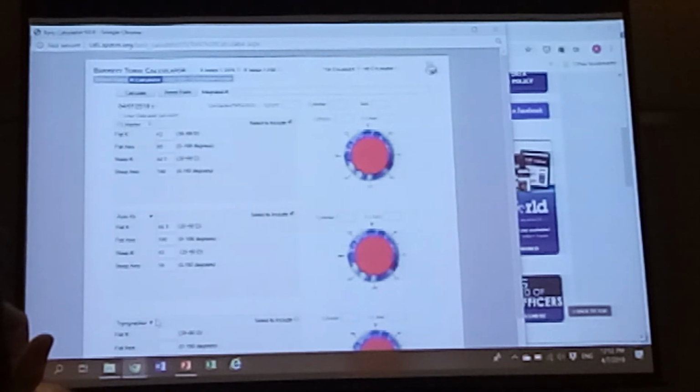Now the third machine I use is typically a Pentacam, but you could use manual K, you could use any of the other machines if you want to. Let's call this a 41.75 and let's make this 110, even further out, okay? And then let's move this down.